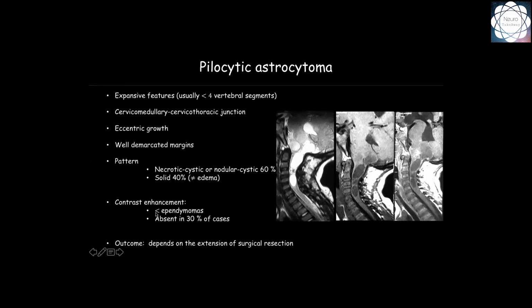They usually enhance with contrast with different patterns. You can see here a heterogeneous pattern in the solid portion and the enhancement of the walls of the cysts, but there are around 30% of cases without enhancement. And the outcome depends largely on the extension of the surgical resection.